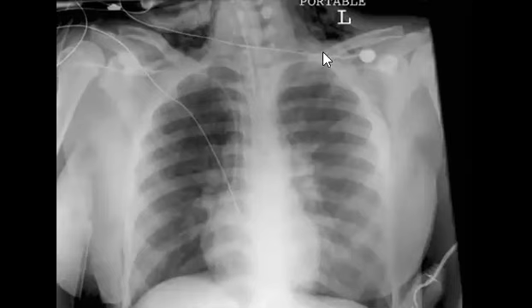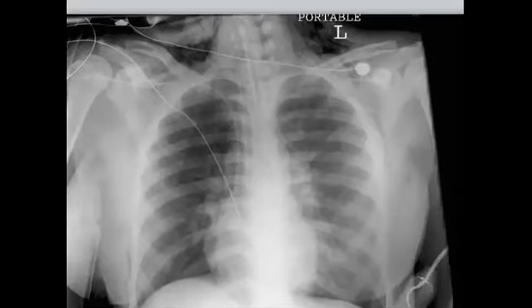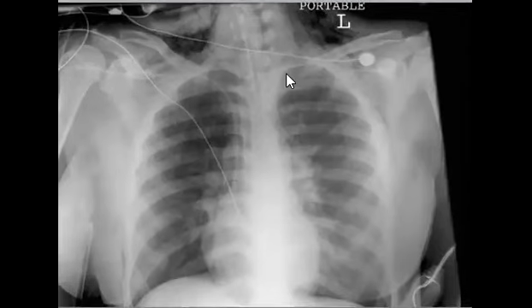So always remember, when we find surgical emphysema, and this patient, as you see, is portable, we mentioned this rule: search for pneumomediastinum. If there is any air lucency beside the mediastinum, we are talking about pneumomediastinum. Okay, is it easy? Because I didn't see the answer until now.